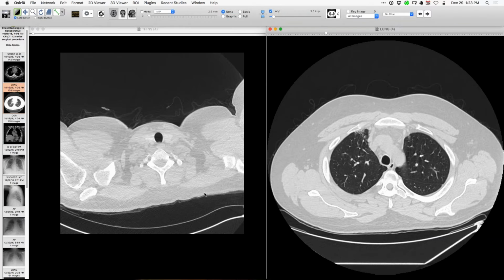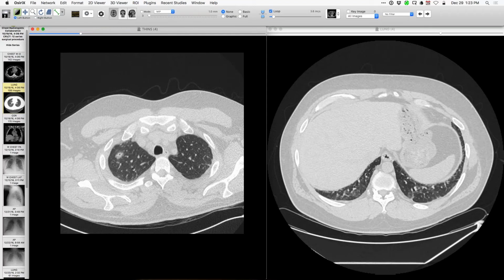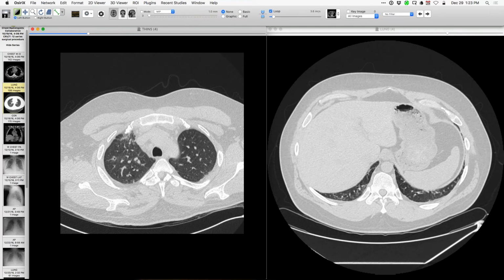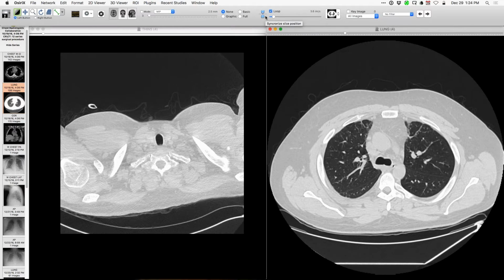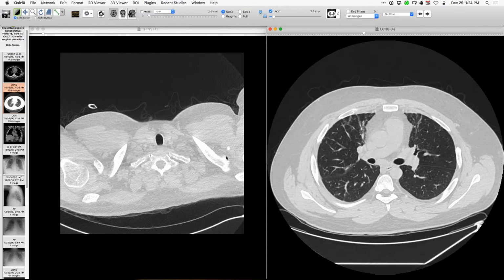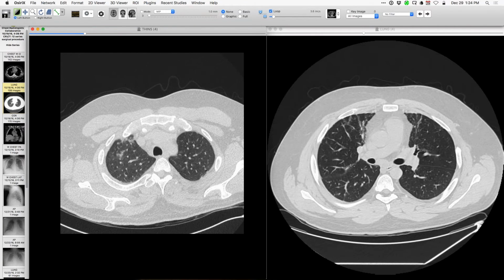And it was suggested in the differential diagnosis that this could represent cavitary infection. But the key piece of information that wasn't readily available was the fact that the person had a transbronchial biopsy. Based on some outside information as well as some findings, sarcoidosis was a consideration. Basically they did the transbronchial biopsy, but they did it in the right upper lobe, and that's the key piece of information.